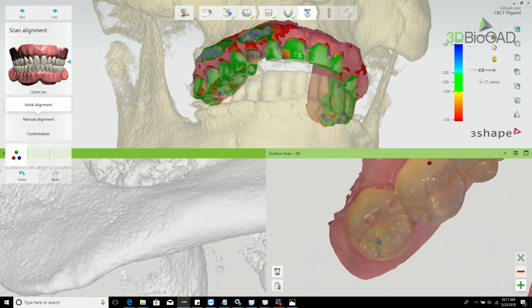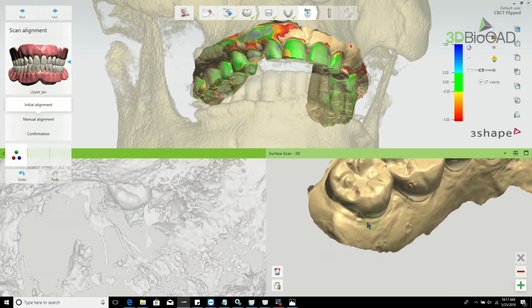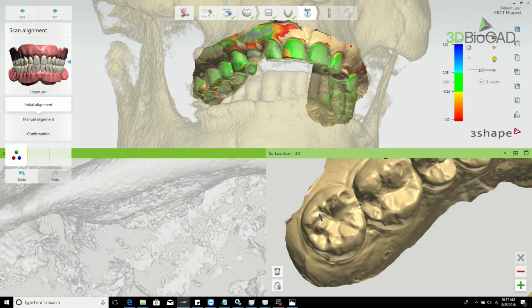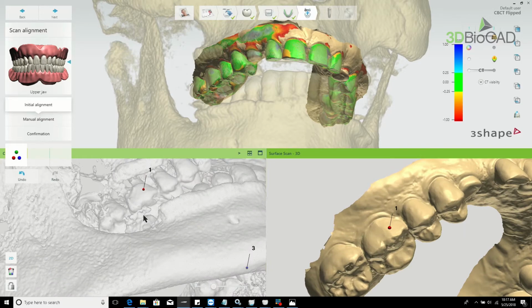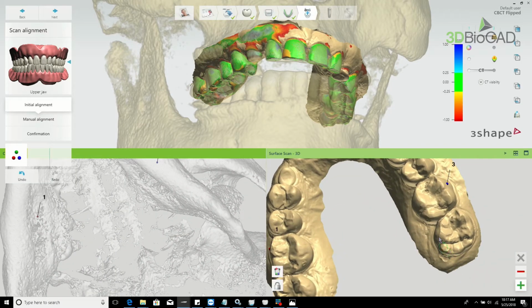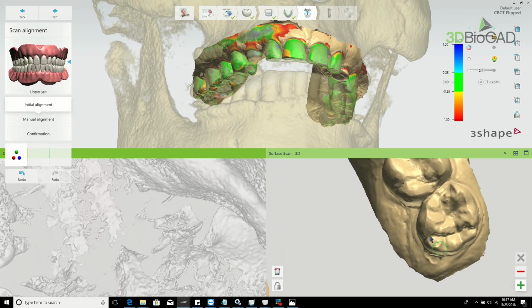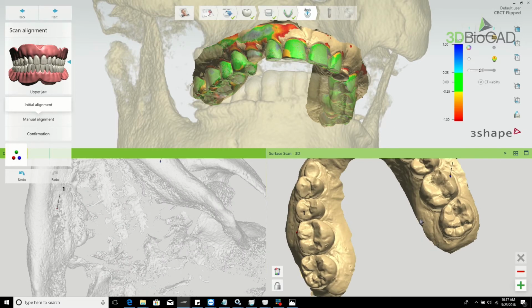With the scan file, can you feel that something is different? Let me switch over to monochrome. We have cusp tips 1 and 2, and 3 and 4 are a little weird, right? Can you see that difference? If you look at the other side, we can feel it right away. So the buccal side two cusp tips are here, and the lingual side cusp tips, especially the distal one, are here. So sometimes it happens like this.